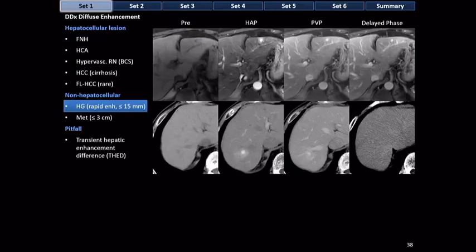And I will often dictate, like on this CT, how would I dictate this CT? Assuming this patient has no cirrhosis, I would say there's an 8 millimeter hyperenhancing nodule with a perfusional halo that fades to isoattenuation. This is highly likely to be a hemangioma, and I would not recommend any sort of follow-up, assuming, again, that the patient has no cirrhosis and no history of cancer outside the liver. And then for the patient on the top, I wouldn't even give that differential.